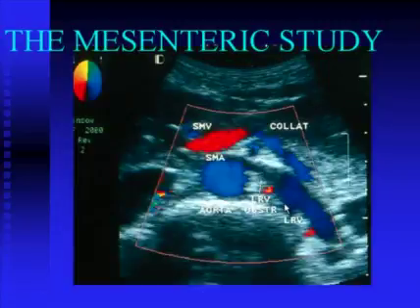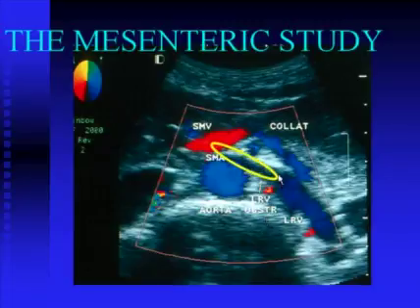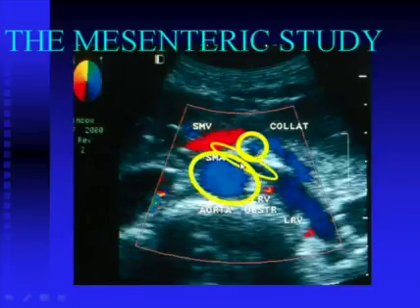So again, what that will look like with duplex ultrasound is you will see the left renal vein right here extrinsically compressed as it is trapped between the superior mesenteric artery and the aorta. The extrinsic compression in this case has chronically led to complete thrombosis of the mid-segment of the left renal vein. The inflow to the kidney has remained the same. The outflow has got to go somewhere, and collaterals will readily develop. There is a small collateral branch even seen here going up to the splenic vein and superior mesenteric vein.